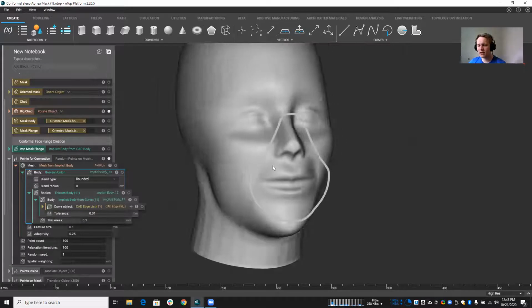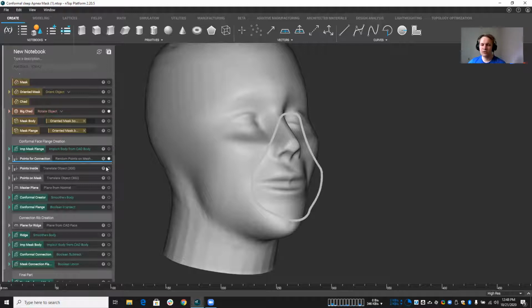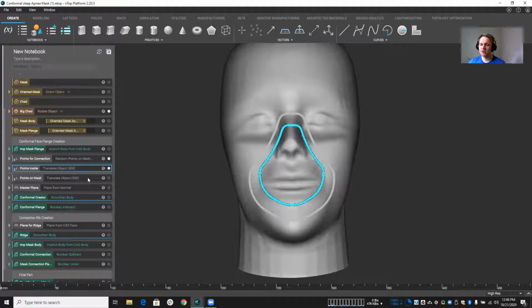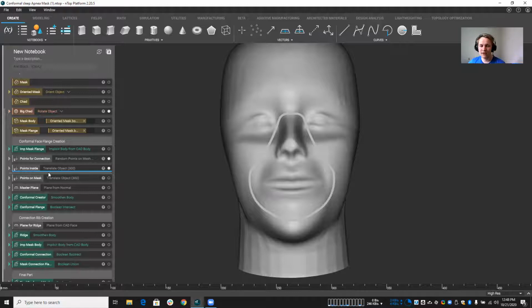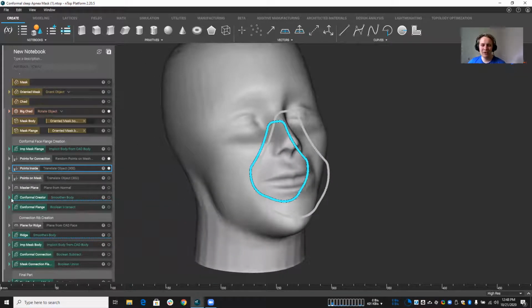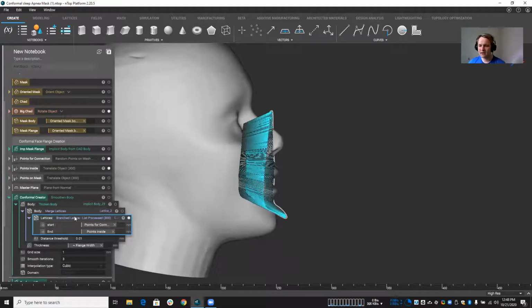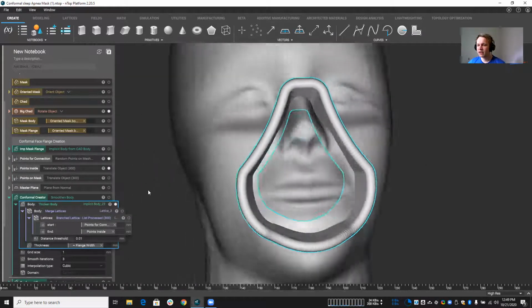So why did I do this? What can I do with these points? Well, we have a lot of control over our points. So what I was able to do was take them and translate them inside of Chad's face here, right? So I took them, did a little bit of work, a slight scaling, and translated them inside the face here. Now, why? The question is why, right? Well, what I wanted to be able to do was take these points, use this branched lattice here, and now I have this branched lattice that's happening. And if I apply a little bit of thickness to this branched lattice, I get this body.